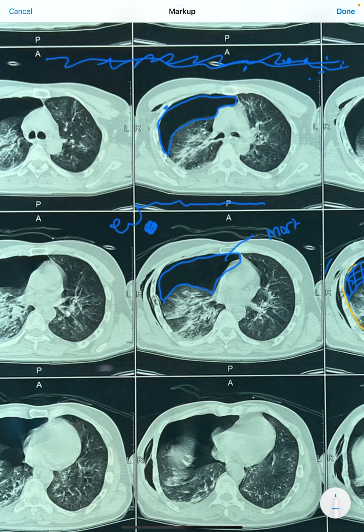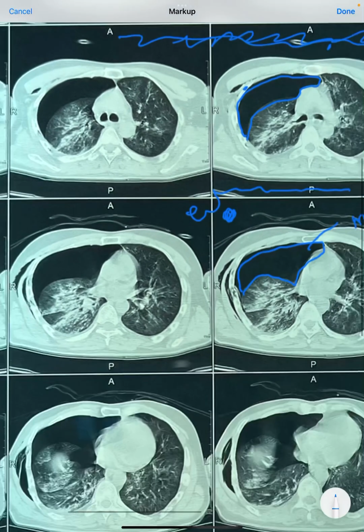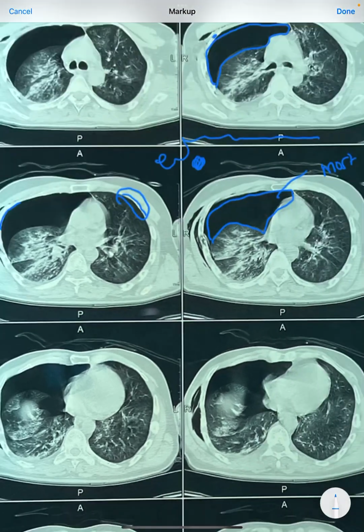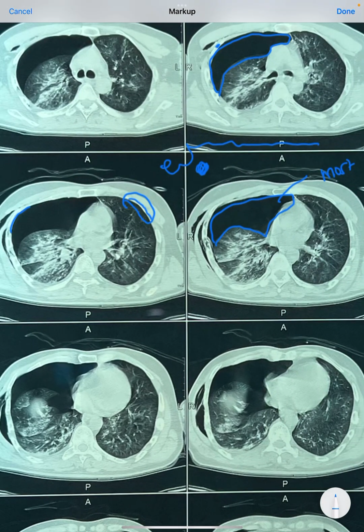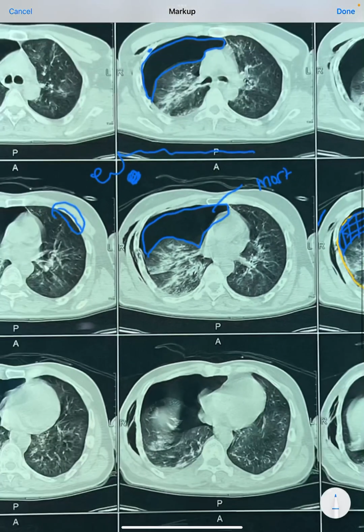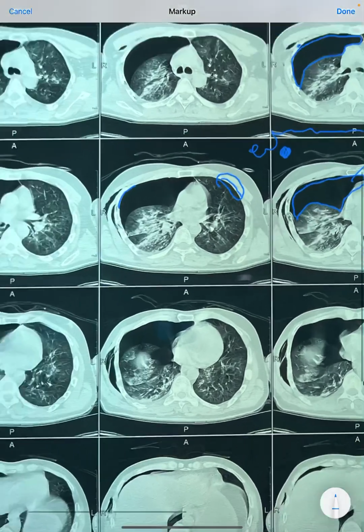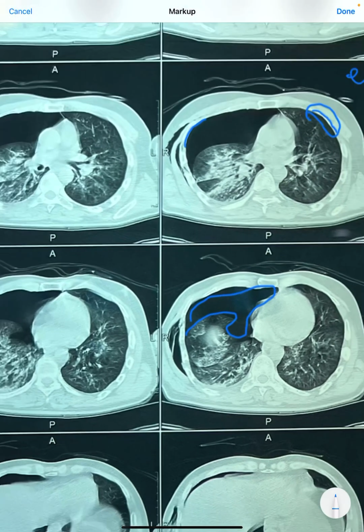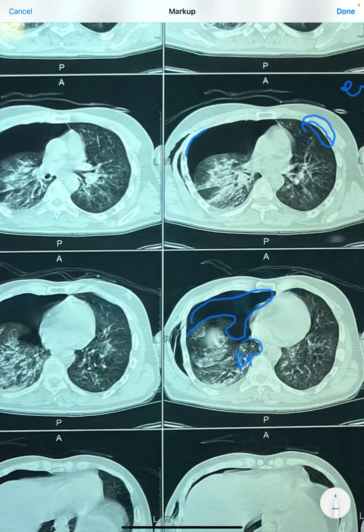These are the ribs, the dense white structure. You can see this is rib, this is rib. So inside the ribs and over the lungs you have a dense black air. So this is a very typical CT scan of pneumothorax. This is typical pneumothorax, which is simply compressing the right lung completely, so that almost this much portion is all compressed.